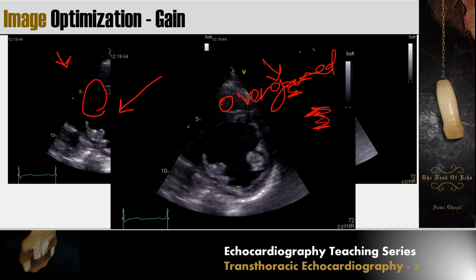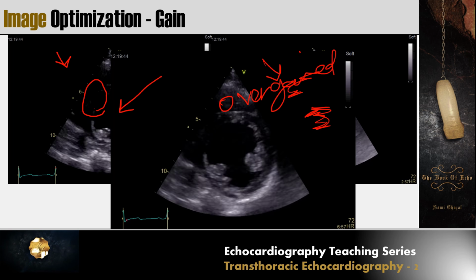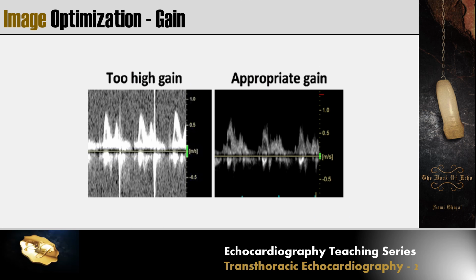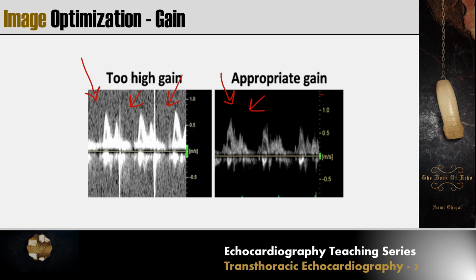And I will show you an appropriate gain like in this image. This image or this video has an appropriate gain where you have a black cavity without losing any structure. Gain does not only apply to 2D image, it also applies to Doppler, being color Doppler or spectral Doppler. In this image here, it has a high gain. As you can see, the background is white or gray. It has to be black. So this one is overgained, and this is how an appropriate gain should look like.